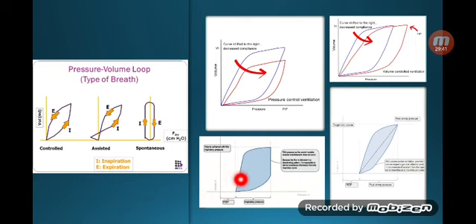You can also learn about the resistance, because apparently with this curve, there was a lot of resistance to inflate the lung, and then suddenly the lung was all over inflated. And then on the way back, the resistance was also high for the expiratory limb. What is that telling you? This is telling you that basically the ventilator is struggling against some kind of resistance at the beginning that doesn't represent what the lung is really having. So this seems like a tube problem. Either the patient is biting the tube, it is partially obstructed, or the tube is really small, so you need to sort the tube.